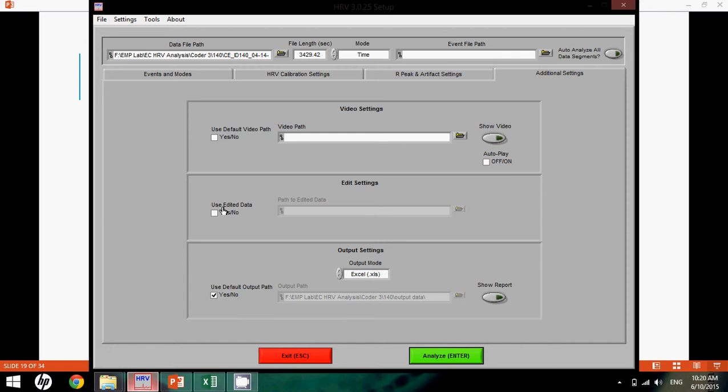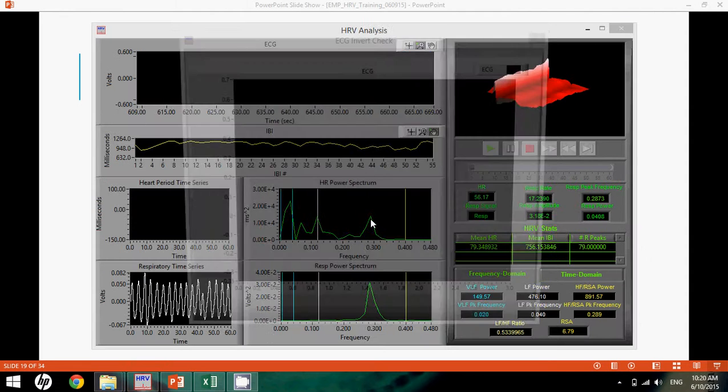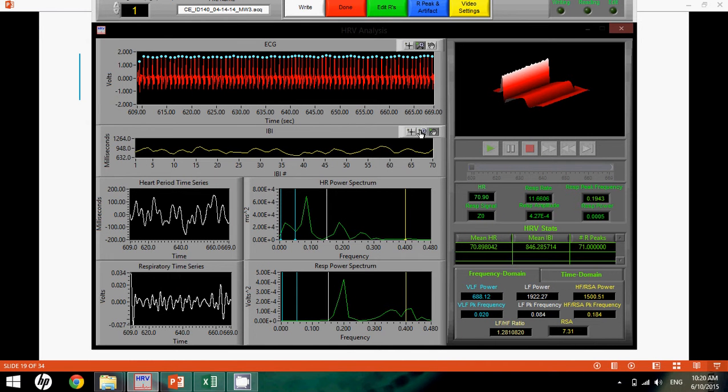And I'm not going to be pulling from an editing file right now. We'll just go ahead and get started. So this will be marked as 01, and this will be the first segment, which corresponds to the baseline in the eating comfort study. So as you see, we have all blue marks so far, which basically designates that we don't really have any problems with this section.